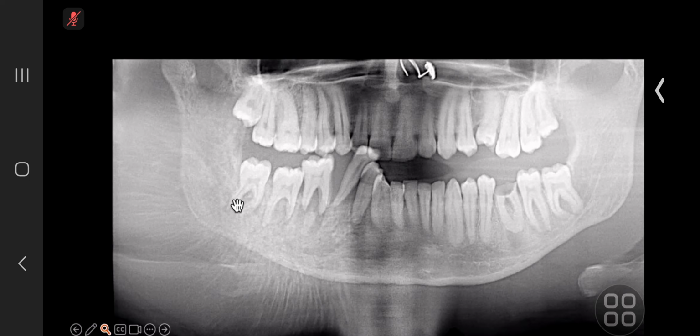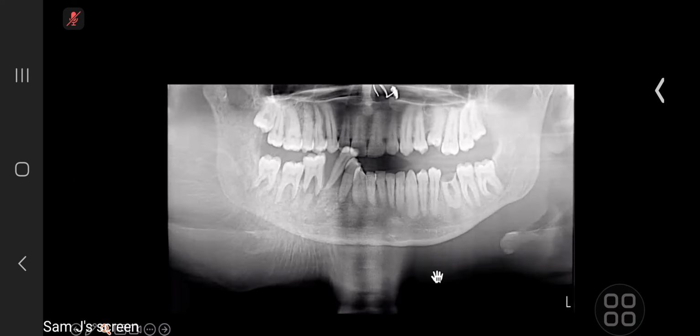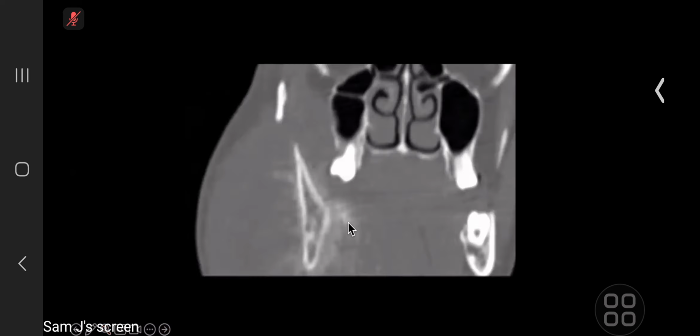And yes, you have to very carefully look for any associated fractures, and any associated calcifications, and also carefully evaluate the left side of the mandible and the central part. Then the CT actually shows haziness of the cortex, and you can nicely appreciate the periosteal reaction and a large soft tissue mass. I couldn't appreciate any bony matrix or mineralization.